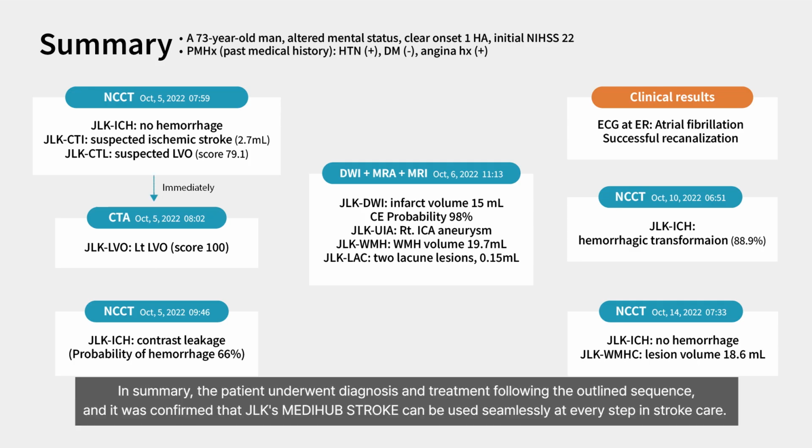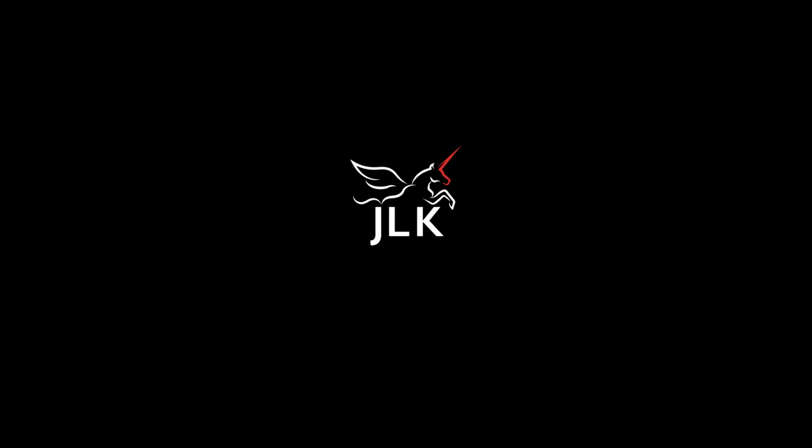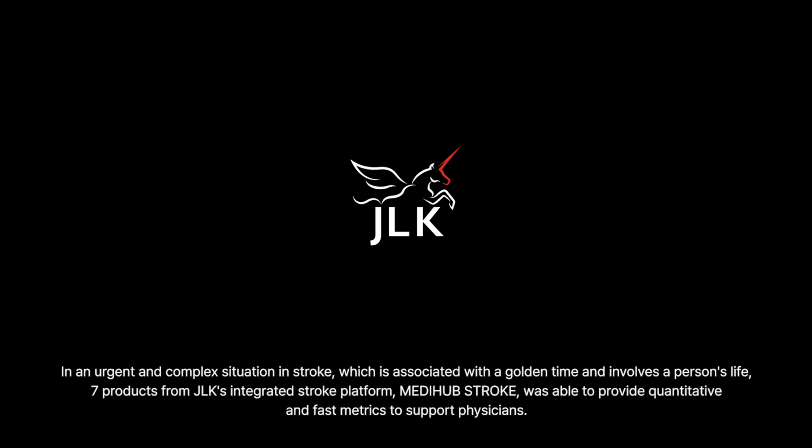In summary, the patient underwent diagnosis and treatment following the outlined sequence, and it was confirmed that JLK's MEDIHUB Stroke can be used seamlessly at every step in stroke care. In an urgent and complex situation in stroke, which is associated with a golden time and involves a person's life, 7 products from JLK's integrated stroke platform, MEDIHUB Stroke, were able to provide quantitative and fast metrics to support physicians.